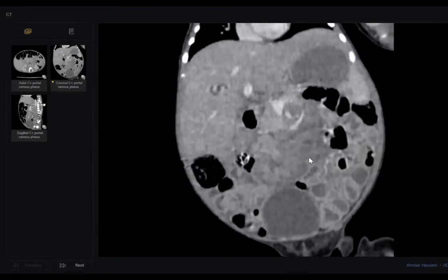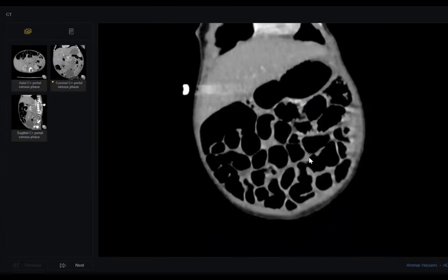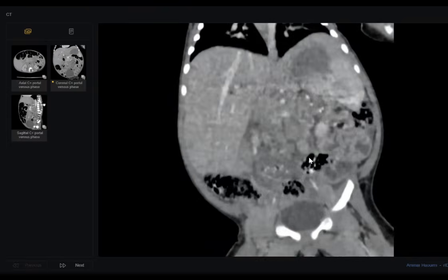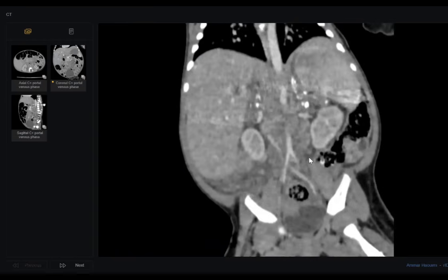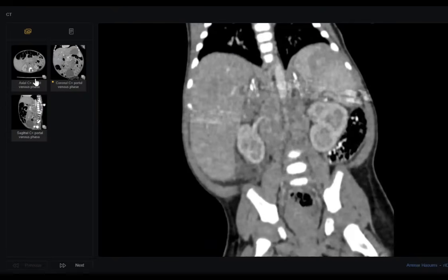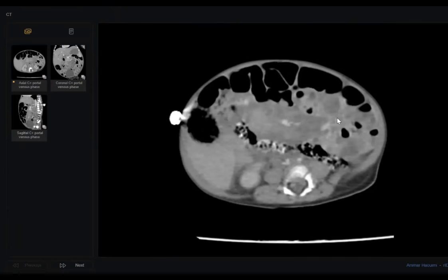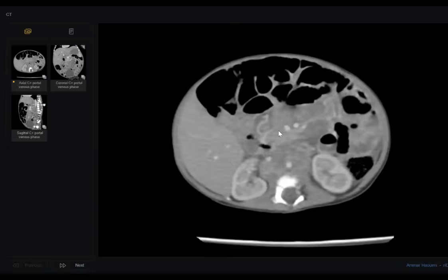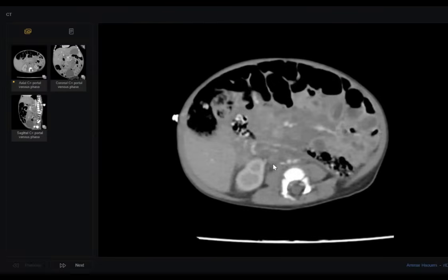Why? When you find hepatosplenomegaly in a 2-month-old with bilateral suprarenal calcification and lymph nodes, your mind should shift to a metabolic disease, or a systemic disease. My colleagues, is it clear for all of you? Here, why is this lymph node? Because look here, it is elevating the vessels. You were correct, Doctor, surrounding the retroperitoneum here, but really the resolution is very bad.